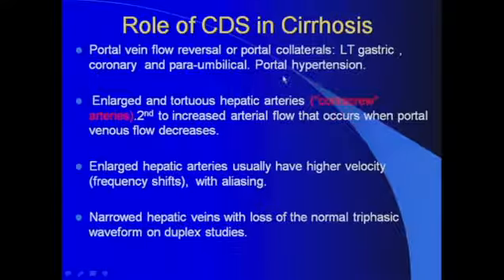Now, it's very important to keep in mind that in a good percentage of patients without advanced grayscale imaging, they may start to show these findings of portal hypertension, which is really important to include your color Doppler evaluation in every right upper quadrant ultrasound in patients known to have chronic liver disease. So what are the findings that are expected in addition to the portal vein findings?